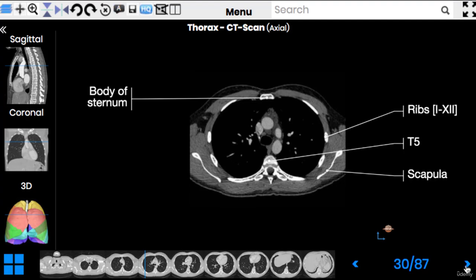At the level below we do not see any arches, but what we have now is the ascending aorta in front and the descending aorta behind. The ascending aorta leads us to the left ventricle, and the descending one is going to continue down to the abdominal cavity.